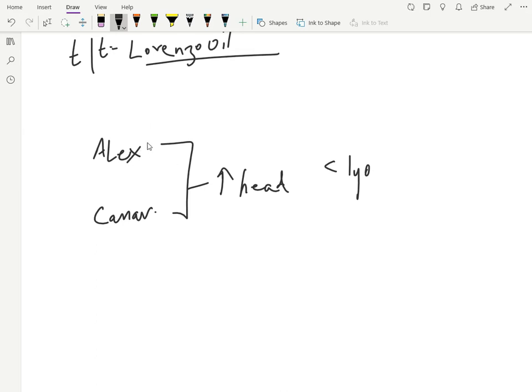So what's the difference? Alexander usually involves the frontal white matter. I usually remember it as Alexander the Great. He was a leader. He was always in the front. So frontal white matter. And Canavan, it involves diffuse bilateral subcortical U fibers.